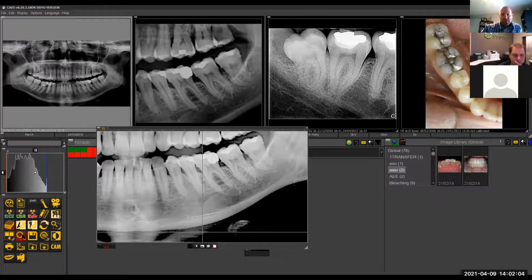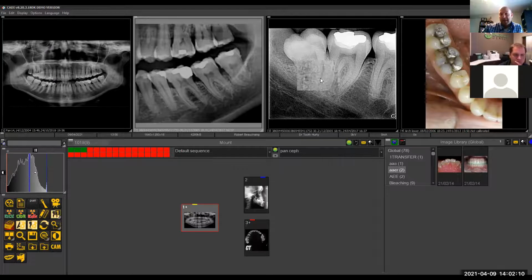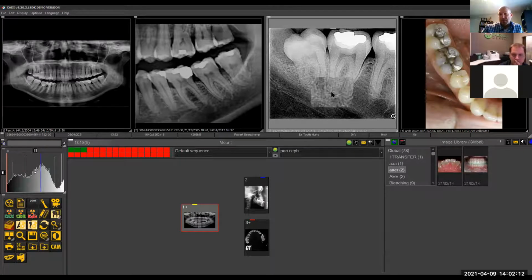With most software, there's usually 50 things you'll never do, and that might be one of them, because the typical magnify that everybody uses is the right mouse button and zooming in and out. And if you want to use the filters, there are some filters that you can use aside from that window.